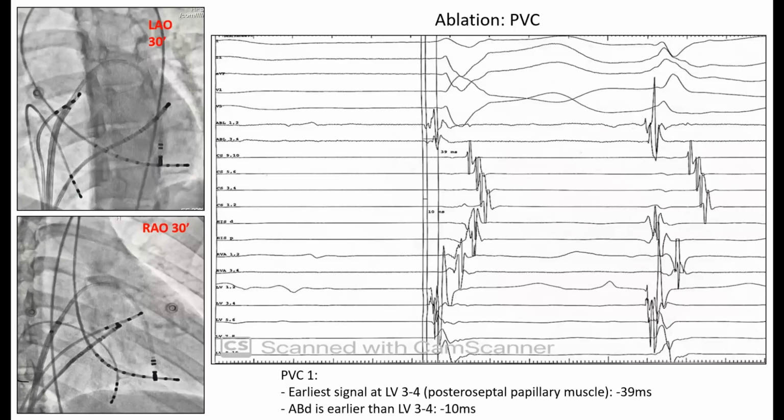And then as you point out, this ablation signal, if you look at the first complex, okay? Do you think this is a clinical PVC? Yeah, I don't think so. It's too wide. So you've got to make sure that what you see is not catheter-induced. And then the second complex, that's the second complex you see in the tracing.